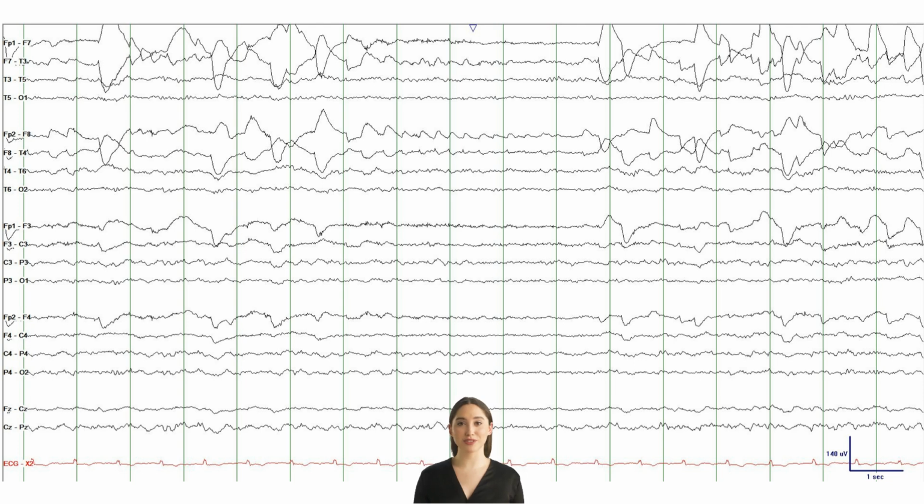But perhaps the most representative feature of REM sleep within EEG is the presence of swift back-and-forth lateral eye movement artifacts. These rapid lateral shifting eye movement artifacts are most prominent in the F7 and F8 electrodes and are a staple of REM sleep. This is in contrast to sawtooth waves, which may not necessarily be present.